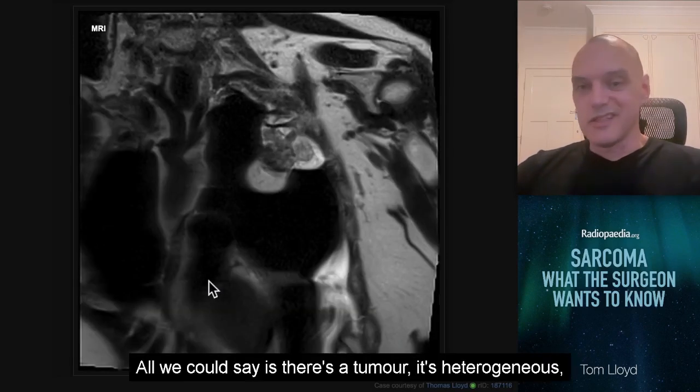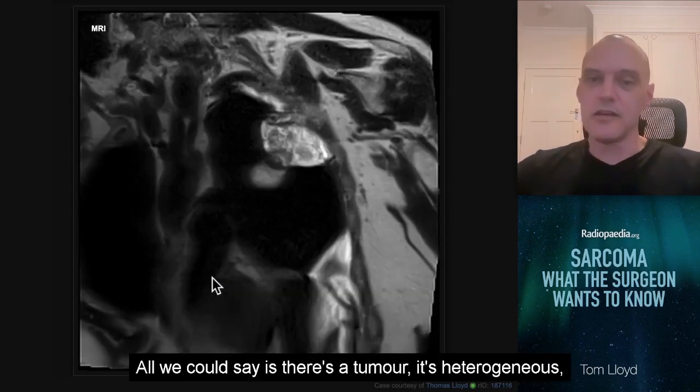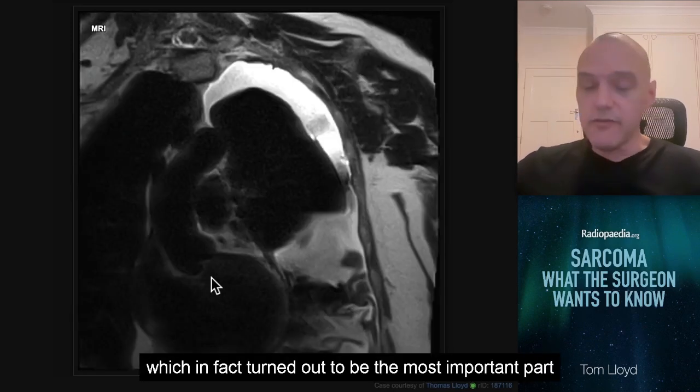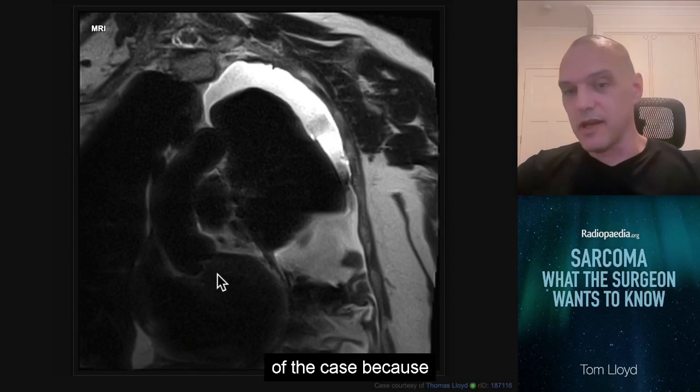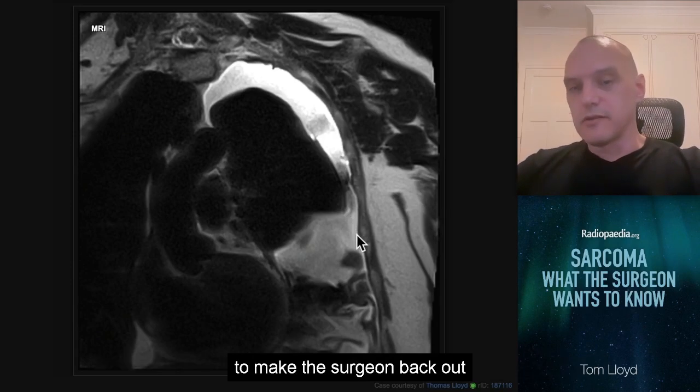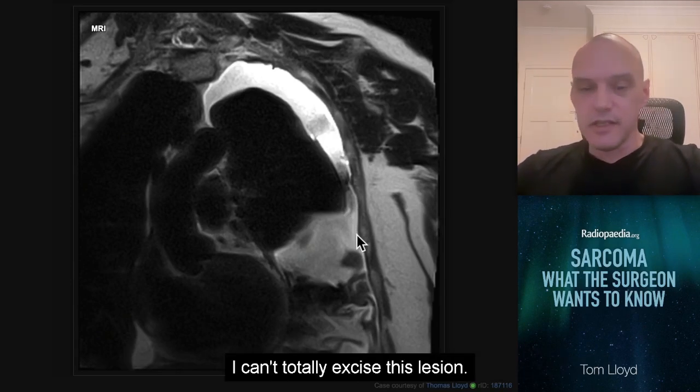All we could say is there's a tumour, it's heterogeneous, it's associated with a pleural effusion, which in fact turned out to be the most important part of the case because the enhancing tumour nodule in the pleural space was enough to make the surgeon back out and say, actually, I can't totally excise this lesion.